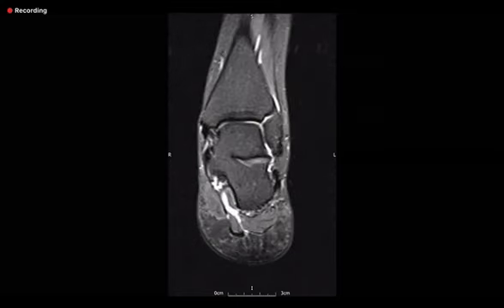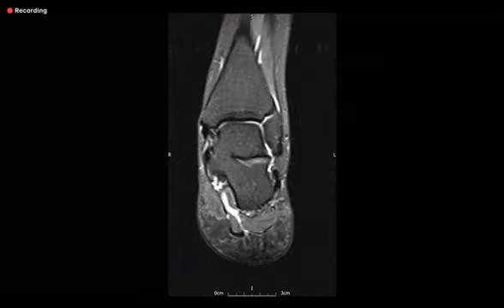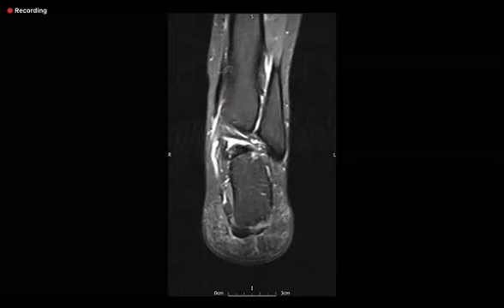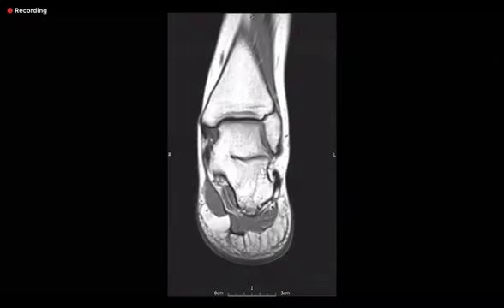Yes, I have. So anatomy-wise, where is this? I am talking about the medial subtalar joint, and I want you to name names here. Which component of the subtalar joint is this? Medial process of the talus. The same thing here. Okay.